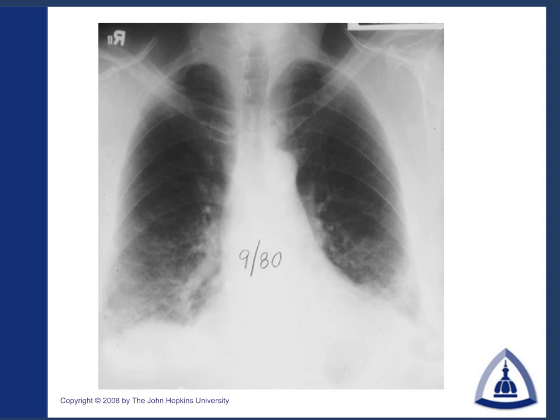This is a patient, we see bilateral lower lobe lines, okay? Interstitial disease. There's no calcification on the diaphragm, no calcification on the pleura, which would point us towards asbestos. This just happens to be a 60-year-old man with progressive shortness of breath over the course of several years with idiopathic pulmonary fibrosis. Okay, again, remember that mnemonic, BADASS.